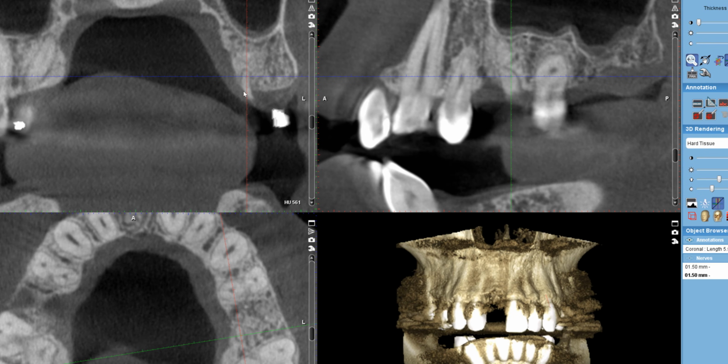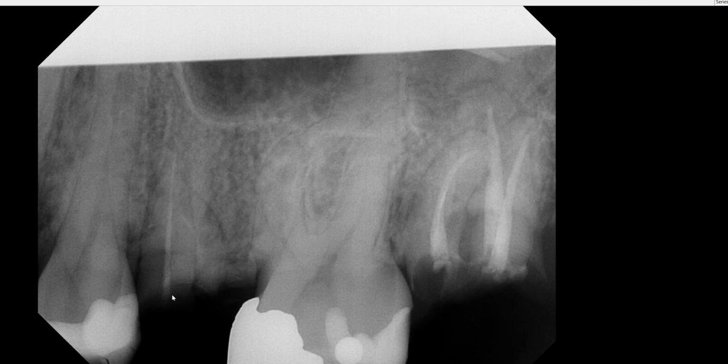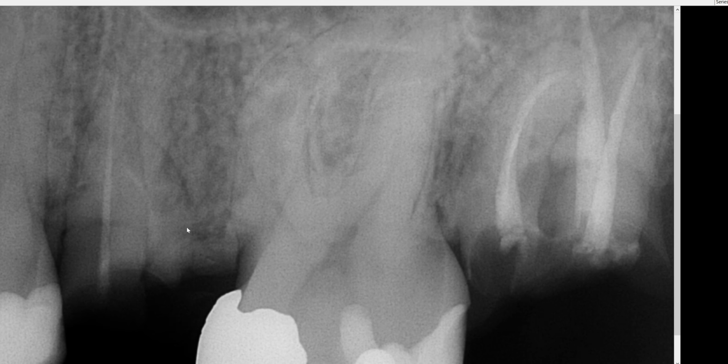So let's take a moment going to go back to the periapical radiograph and see the original one. So here we have a root with endodontic filling material, and you see this other curvature. It's hard to tell exactly where the PDL outline is, but if I had to guess, I see this part of the PDL space, right, for sure.